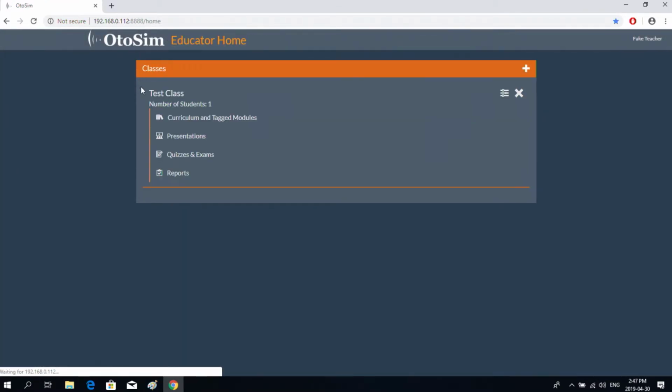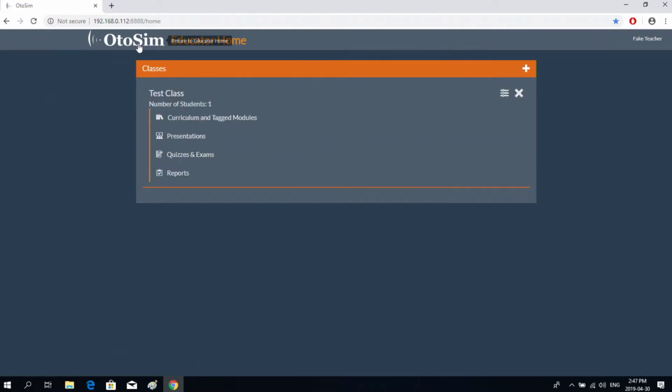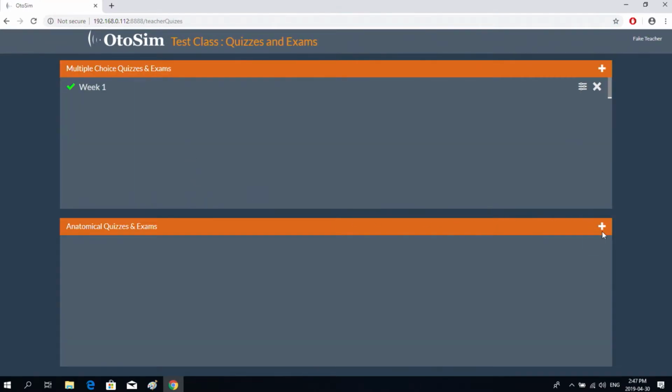So I go back to the home page. If I go into the quizzes and exams, you see that I've got week 1 is the name of the quiz or exam, and I've selected it as a quiz and enable it for the class. Okay, so let's create an anatomical exam.